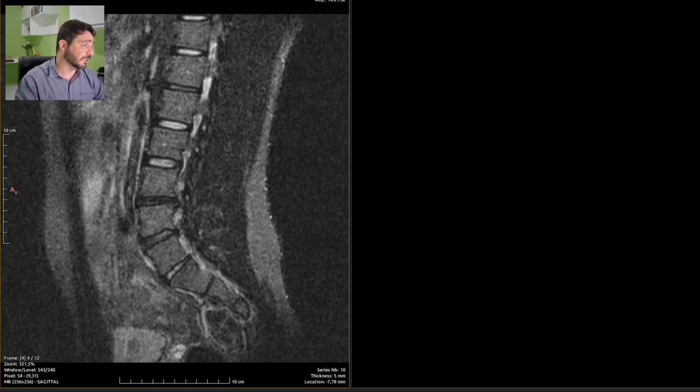He is 19. Let's see. I'll grab my template for a normal scan. Yep, normal scan it is, probably. It just got kind of messy here because I copy and pasted wrongly. Yeah, it's fixed.